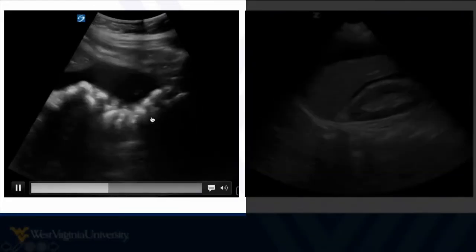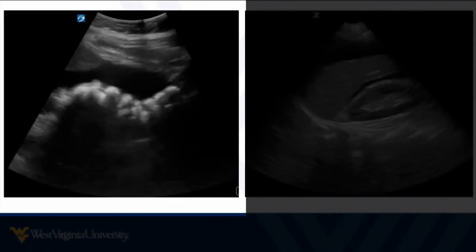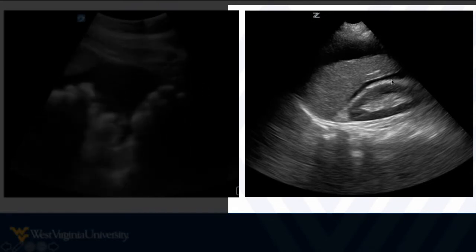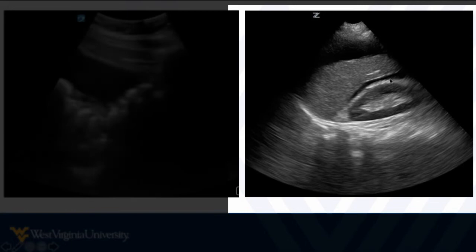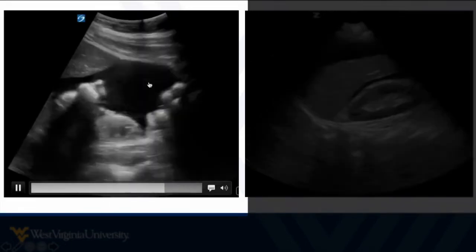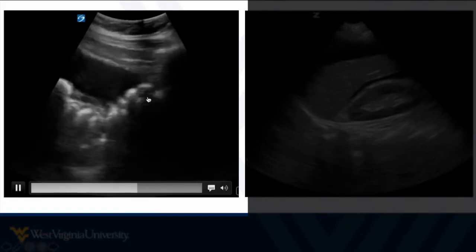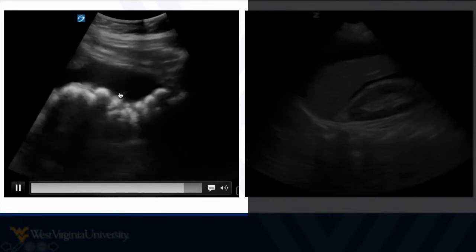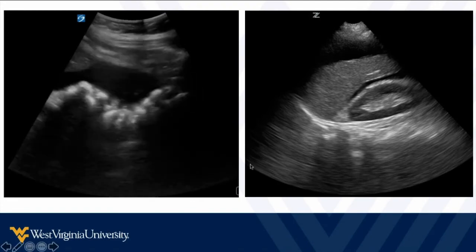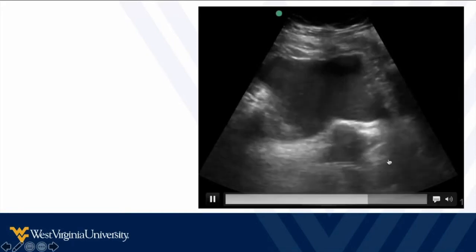So here are some examples of true peritoneal fluid. What you want to recognize, one, it's in the defined areas we talked about, those potential spaces. So here, subdiaphragmatic, Morrison's pouch, and it just fills whatever available space you have, and it takes on little points as it just goes down and fills up whatever's there. Same thing here. We see it compressing the colon and just filling the available space, and you can see these dependent little pointy structures at the bottom, let you know that this is probably free peritoneal fluid. It's not contained within any other structure. It really doesn't take on any nice, well-defined shape.